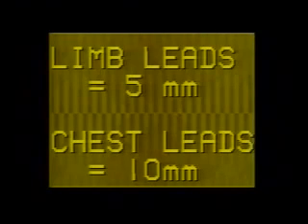Tall T waves. The normal variations in the T wave amplitude are often confusing, and generally T waves should be considered pathological if they are more than 10 millimeters tall in the chest leads and more than 5 millimeters tall in the limb leads. In the evaluation of tall T waves, the associated ST segment changes are very important.